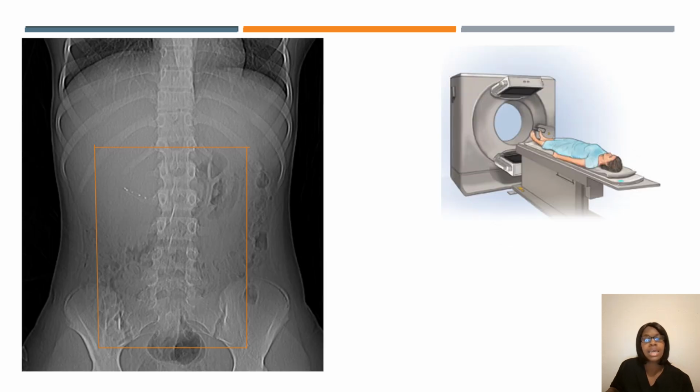So if I was scanning a lumbar spine, this is how I would set it up. This is just what I do. I try not to come close to any parts of the anatomy, especially if a patient is subject to move. I do not want to clip anything.